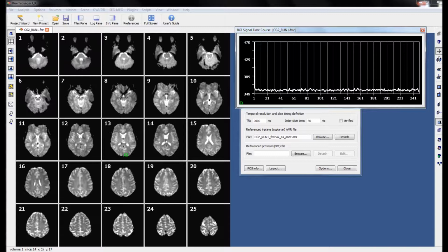We can see the effect of this if we do a basic general linear model analysis. But first, Brain Voyager needs to know which part of the signal corresponds to which condition in our experiment. This is done by attaching a protocol file to the FMR. The protocol of the experiment can be defined manually in Brain Voyager. However, typically it's better to create log files from your experiment and then use custom code to convert this into a protocol file. We will cover how to do this later, so for now we will use the protocol file that Brain Voyager provides for this data.